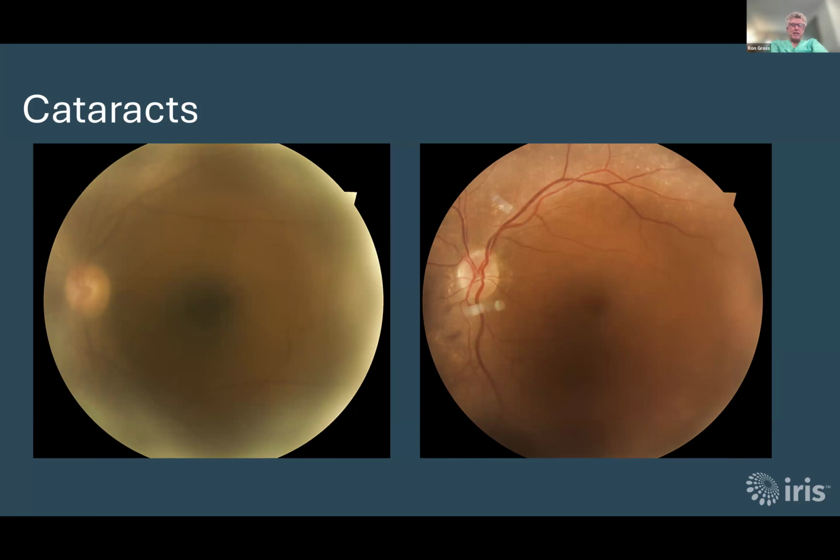And if this amount of haze and cloudiness is present, the patient ought to be seen so that they can make sure that it is cataracts or what's underlying it. It's important to know that if the image that you take is out of focus, it may mimic this. So it may be difficult to tell whether this is blurriness due to not having proper focus or from cataracts. So all the more reason why we get as crisp a picture as we can get. Next.